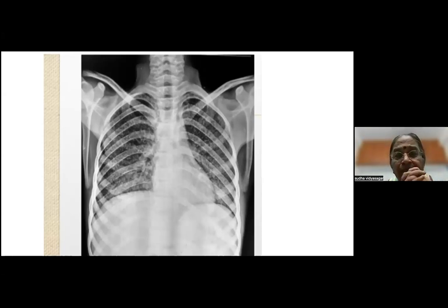Again, a simple X-ray. Okay. How do you know it's TB? What are the differentials for a miliary? Only tuberculosis? There's so many, no?